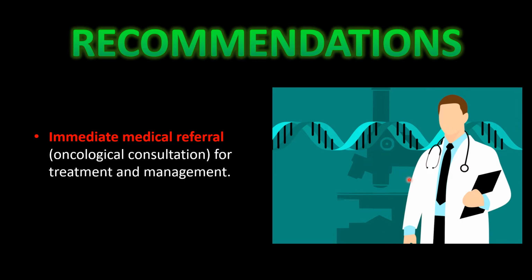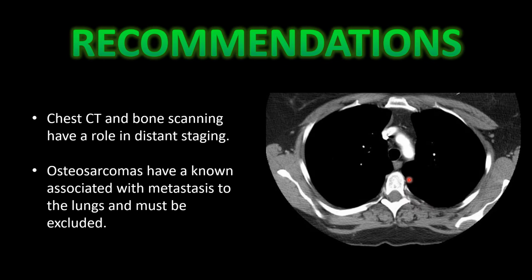From a recommendation perspective, the most important thing is that this patient has an immediate medical referral. Preferably oncological consultation, and this will be for the evaluation, treatment, and management of this lesion. Imaging of the chest is also important. Chest CT and bone scanning have a role in distant staging, and osteosarcomas have a known association with metastasis to the lungs, and specifically cannonball metastasis. So because of this high association, the lungs always need to be evaluated whenever an osteosarcoma is found.